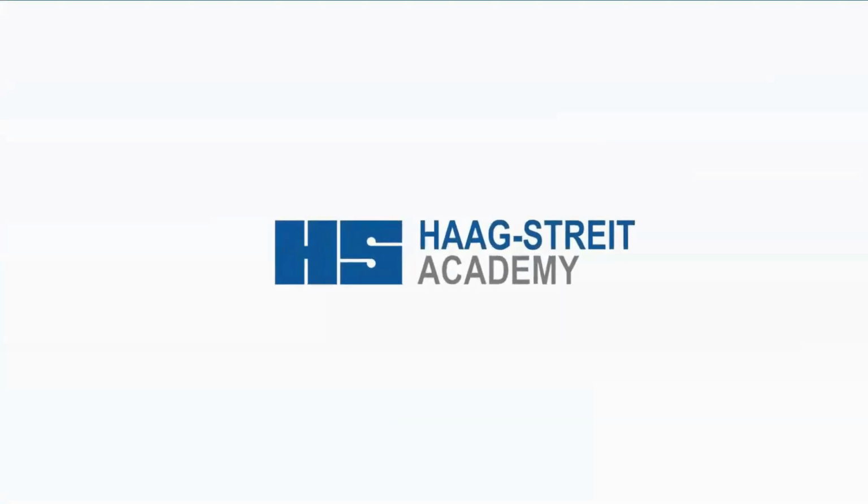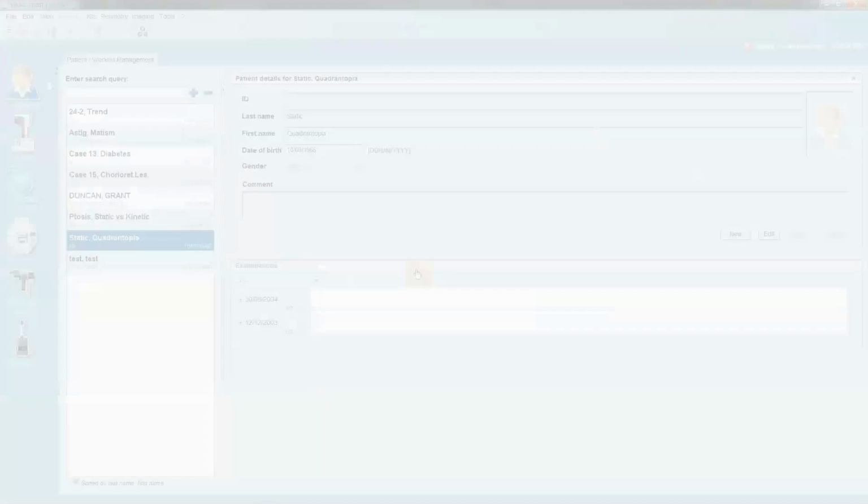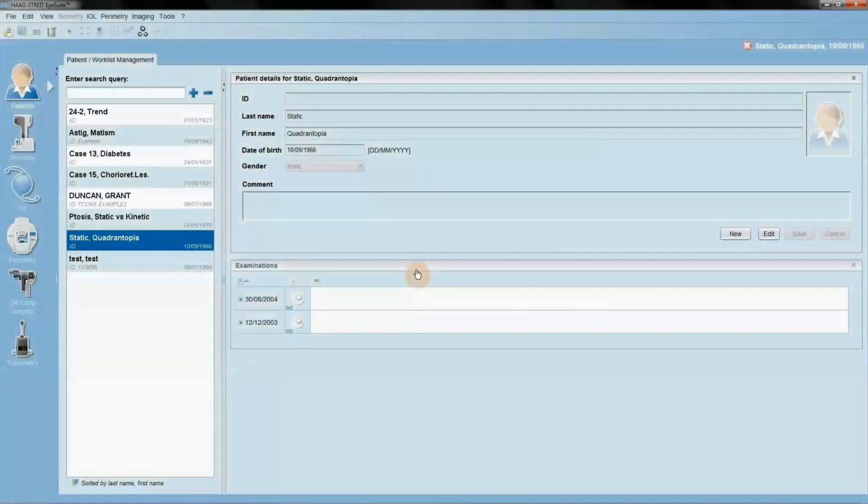A Haag-Streit Academy, EyeSuite, how-to video. Database backup and restore. Backup of the entire database.